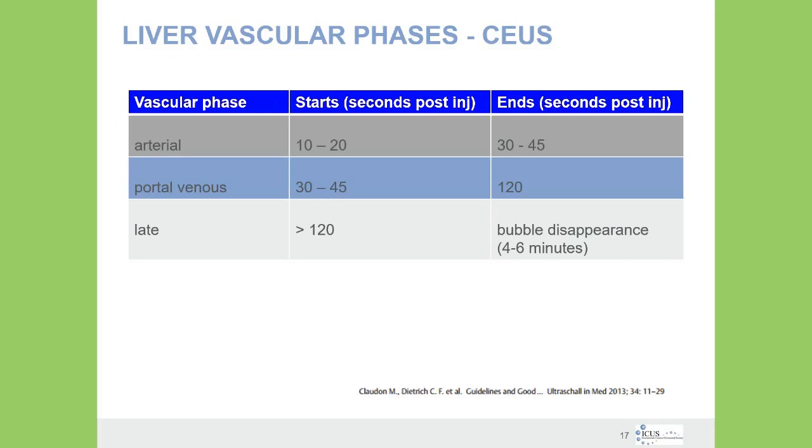Do not get stressed about the numbers because we will see lesions behave differently depending upon what phase of vascular imaging we are examining. Okay, and we'll see what that means as we look at some clips.